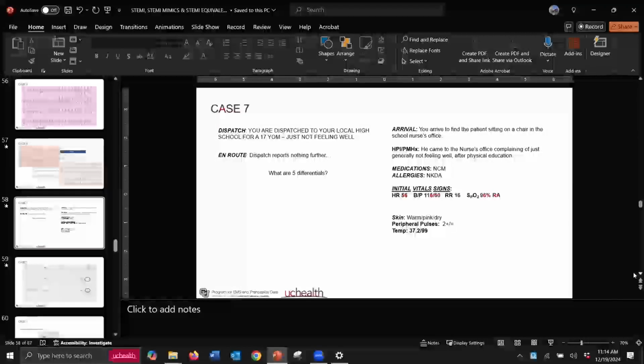Case 7. You're dispatched to the local high school for a 17-year-old male just not feeling well. Dispatch reports nothing further. What are your differentials? He has a test today. Absolutely.